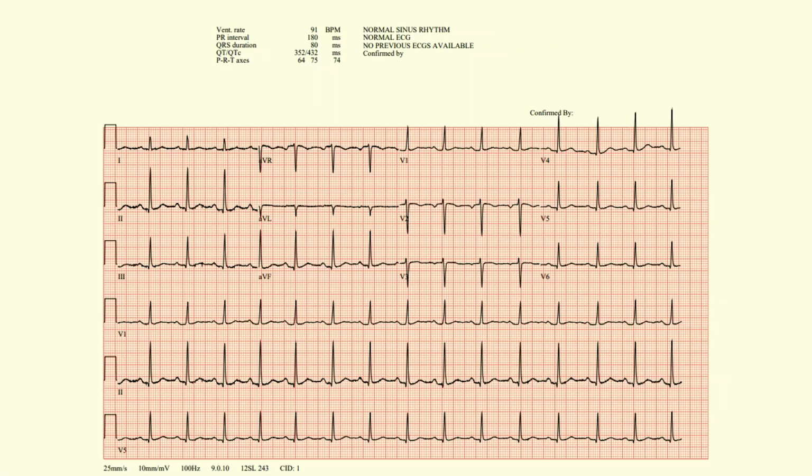All right, so anatomy of an ECG. So you've all seen one of these standard 12-lead ECGs, and you've looked at probably most of the numbers here, but maybe not all of them. You've certainly looked at the rate. You've looked at the PR interval, the QRS duration, the QT and QTCs. Axes, maybe. Maybe we've seen those before. P-wave axis, not sure. T-wave axis, question mark. Who knows what that is? We'll talk about that. Does anyone know what this little box is?